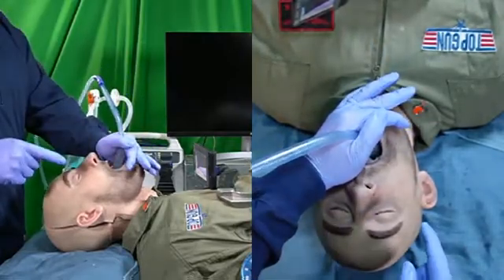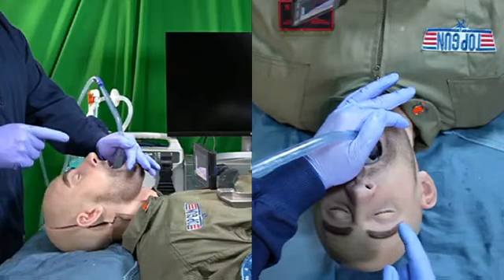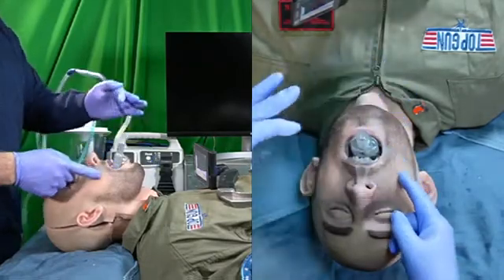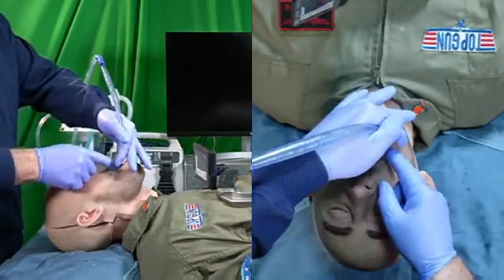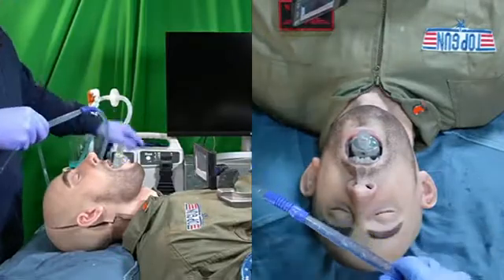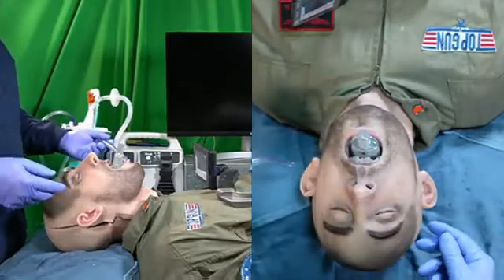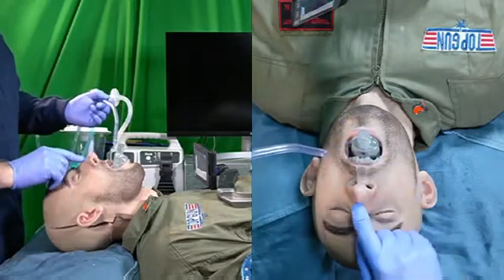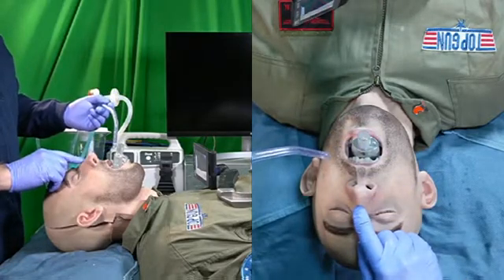This is a rapid airway decontamination maneuver that essentially uses the supraglottic as a suction itself. And as you can see, our test lungs deflated a little bit as I did this, so I know I have a seal. During periodic ventilation of the patient, this can be a rapid way to decontaminate the ventilation channel during clinical use.